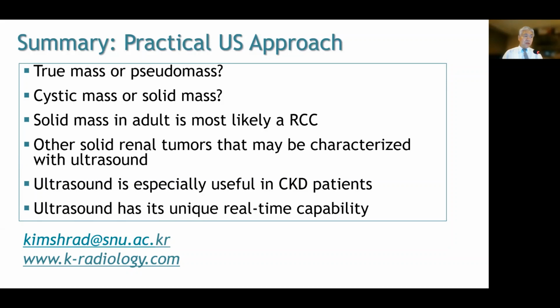And ultrasound is especially useful in patients with chronic kidney disease. And finally, try to use unique real-time capability in evaluating large solid renal masses.